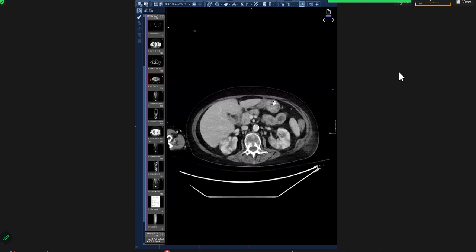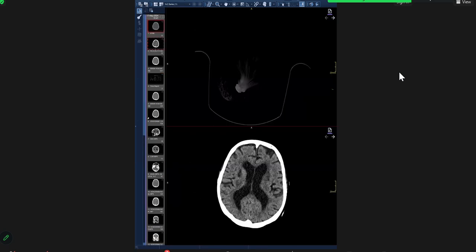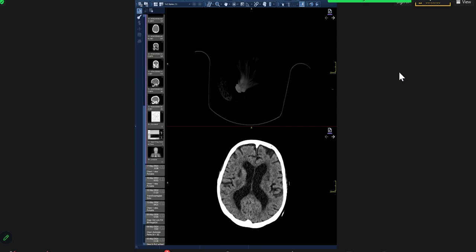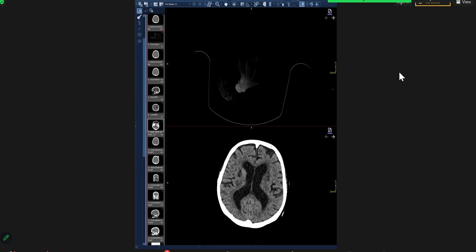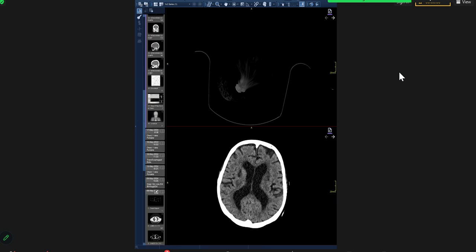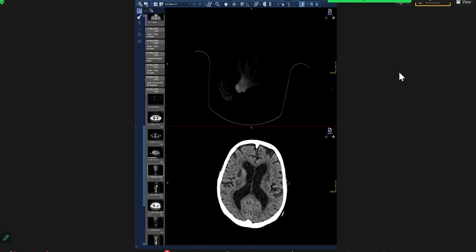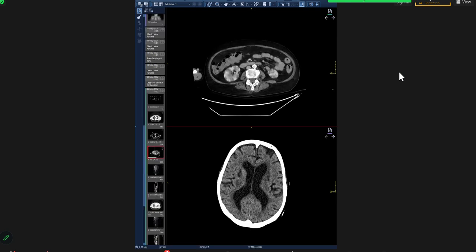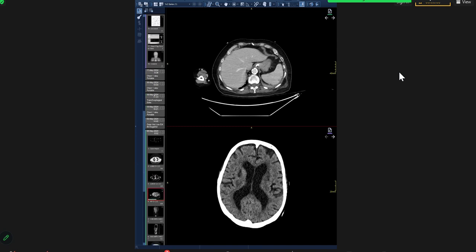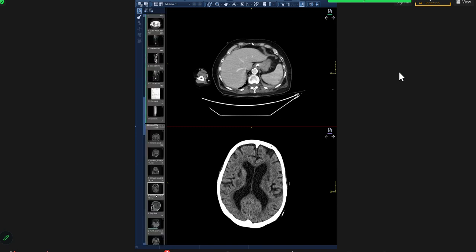So I'm suspecting, and now again I'm thinking about infarcts, or a thromboembolic process. Okay. So let's go back to the same image again.